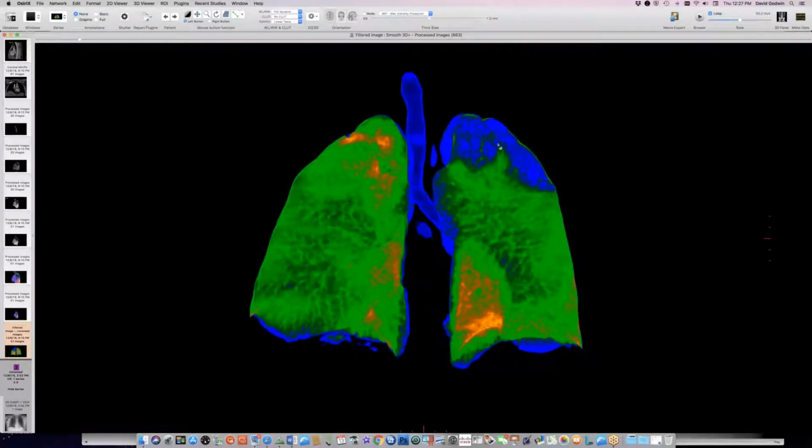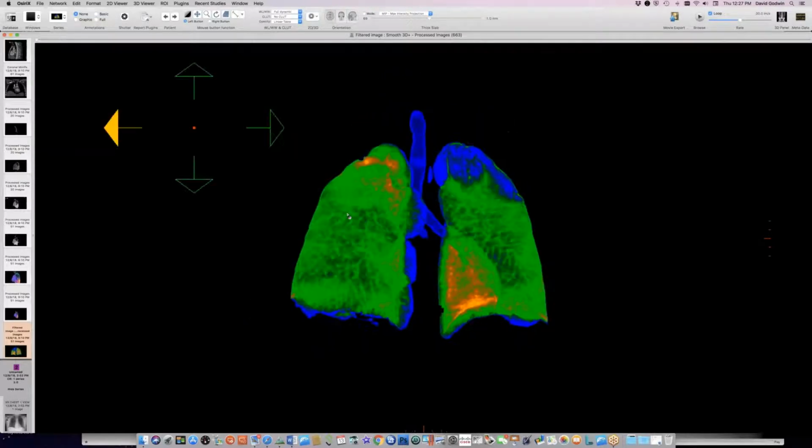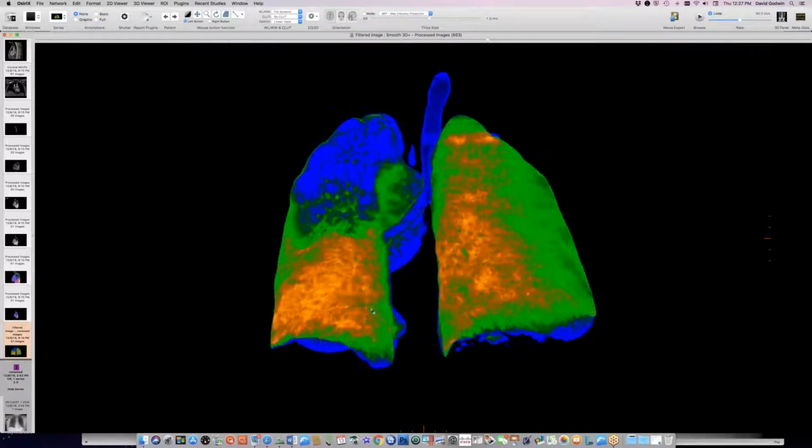Initially, you just showed the abnormal side, this left side with the air trapping, and I thought it would be nice to have the comparison of the other side just to show what normal lung attenuation would be as represented in this color map. And posteriorly, because of dependent atelectasis, we have higher attenuation in the lung.